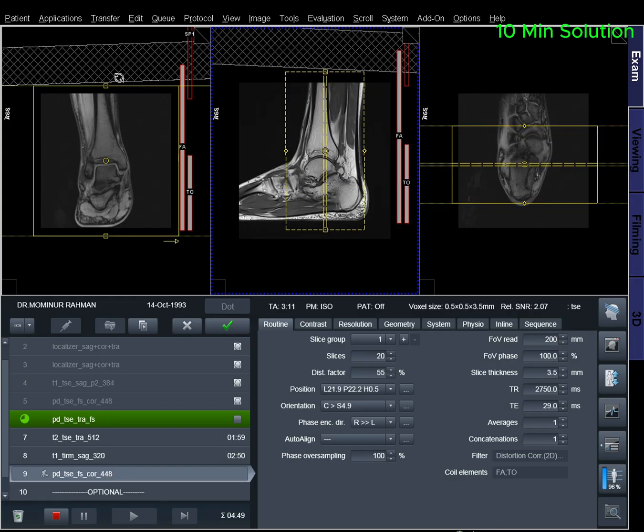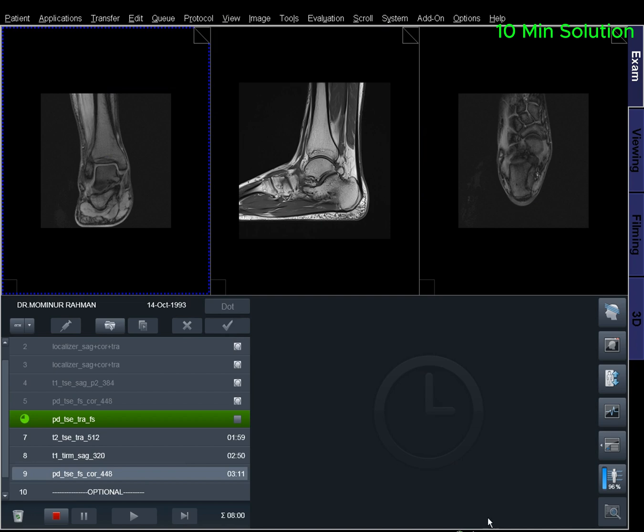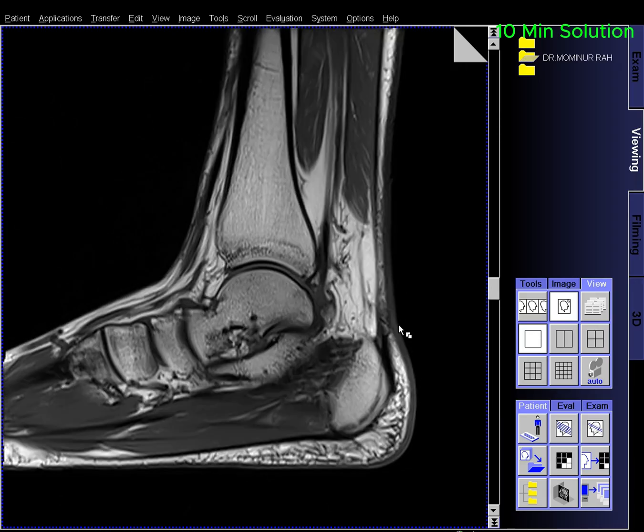Osteochondral and articular cartilage abnormalities. Abnormalities of other hind foot tendons. Plantar fasciitis and fascial rupture. Neoplasms of bone, joint, or soft tissue.